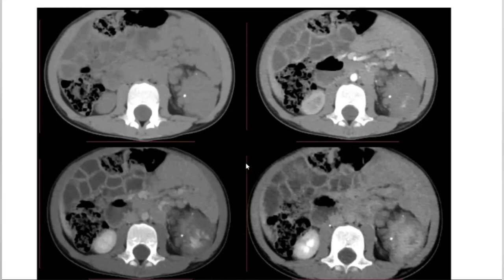So this is hemangioma. You need to understand that hemangiomas can act like hepatic hemangiomas anywhere in the body. They can pool the contrast progressively on the venous and delayed phases. So you will see this pattern if they're elsewhere in the body, whether in the subcutaneous soft tissues or intramuscular lesions. They can still present like a hepatic hemangioma. So this was a hemangioma, and these were phleboliths within this lesion.